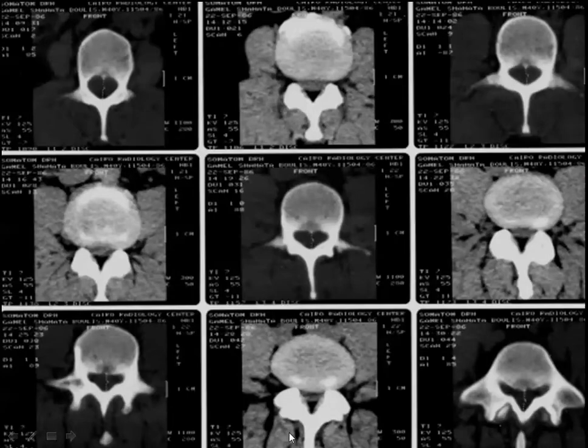Starting the evaluation of the spinal canal, you ask yourself about the canal: is it bone or soft tissue? You know that the spinal canal is bone, but inside the spinal canal is soft tissue. But here we are going to evaluate the bony spinal canal itself. Then we should go to the bone window images, and you select the image where the spinal canal is closed, I mean the level of the pedicle of the vertebra.